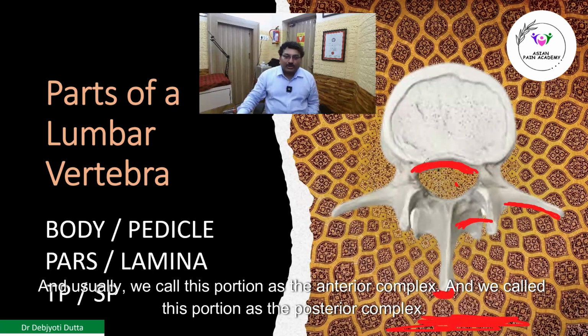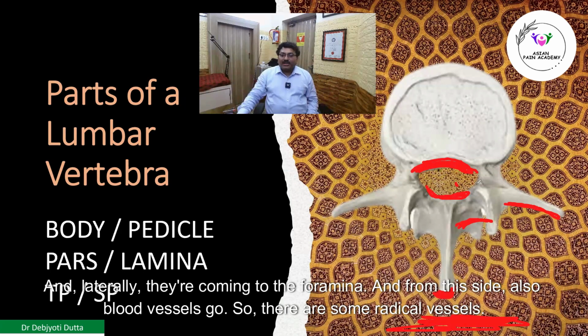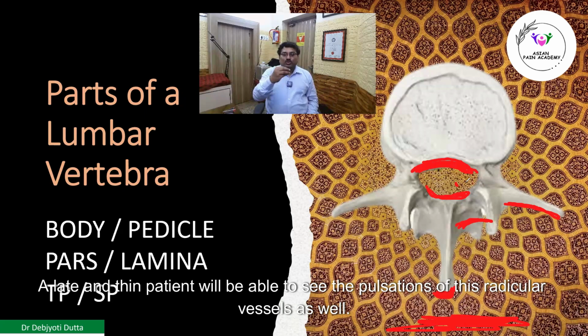And usually we call this portion the anterior complex and this portion the posterior complex. In between we have the thecal space with the nerves going by, and laterally they're coming to the foramina. And from this side also blood vessels go. So there are some radicular vessels. In a lean and thin patient, we'll be able to see the pulsations of these radicular vessels as well.